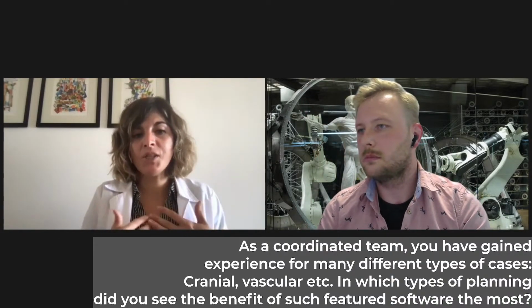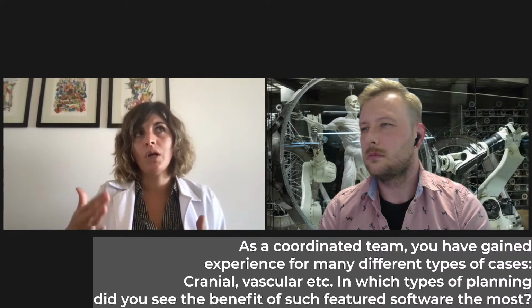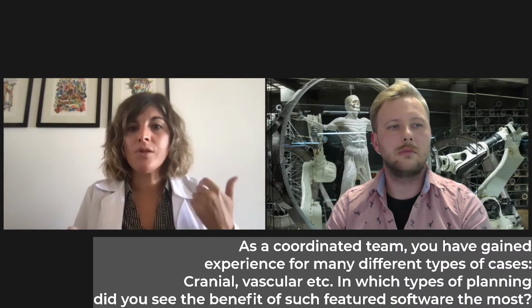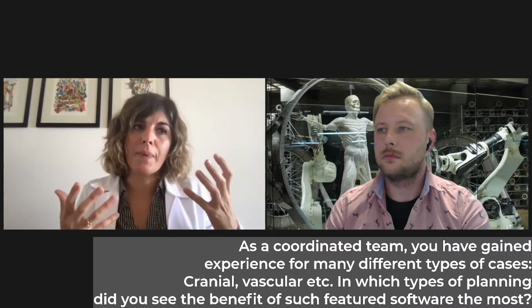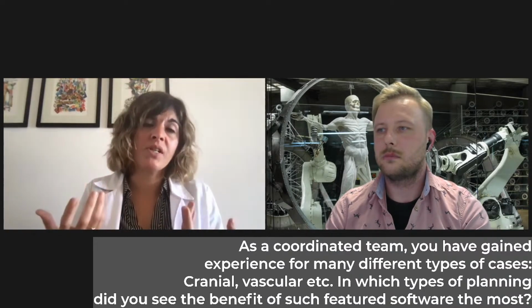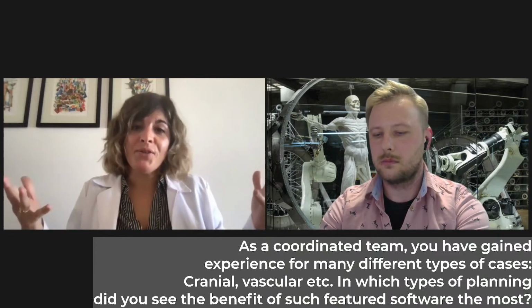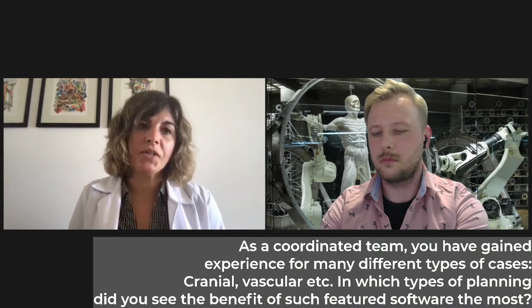And my experience has been that most benefits are for virtual surgical planning, where oncology, or also I work a lot on custom implants with titanium. So in that area, I think also all specialties that work with bones and bone implants in particular, this technology is great, it is what you need.